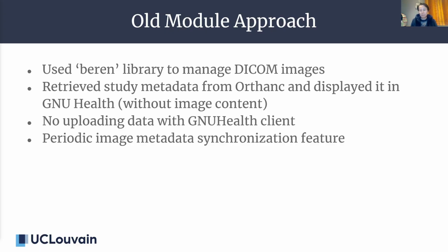synchronization of image data. For the new version of the implementation, I decided to use PyOrthanc, a Python wrapper for the Orthanc server, to focus on the DICOM file management, storage, retrieval, handling, and display of the image data.